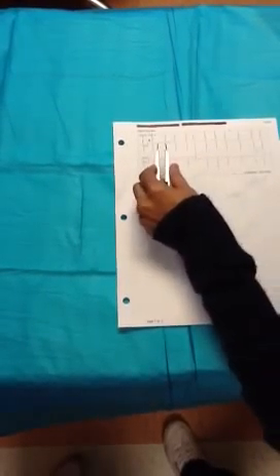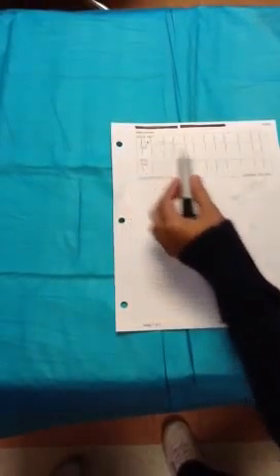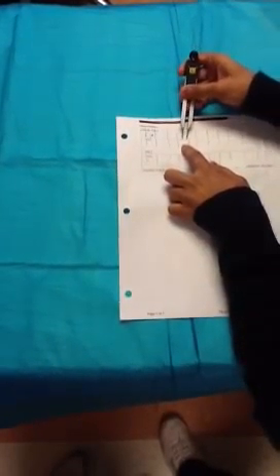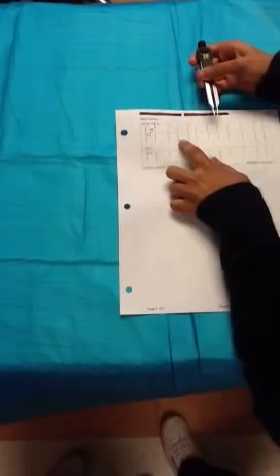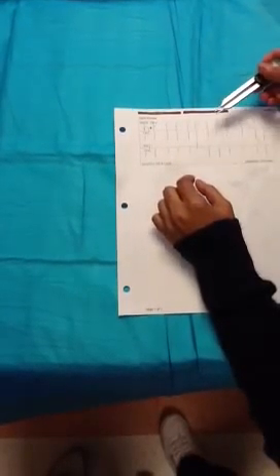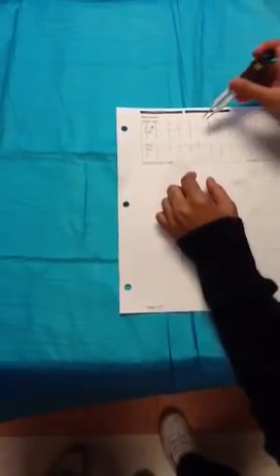You can also tell by looking at the P waves, and there are just so many little P waves that they're not equally spaced either. So then you know that the strip is irregular. Now we try to figure out who to blame. Is there something wrong with the atrium? Then there would have to be a problem with the P waves, which in this case, that's what it is.